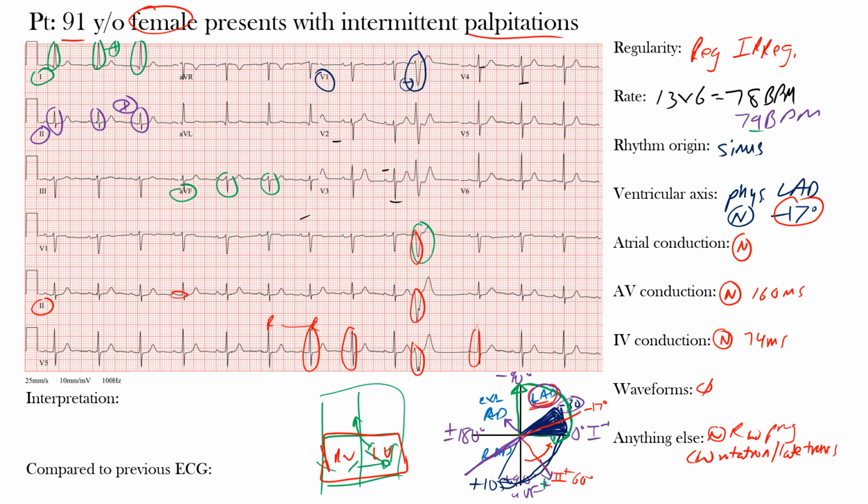Okay, and why is that? Well, imagine lead V1 sitting over that right ventricle. It's one of our right precordial leads. Okay, and if you have the ectopic focus originating from within the right ventricle, it's going to head away from it. So if you imagine V1 somewhere in this region and you have the complex originating from here, it's going to head away from it, so you'll see a negative complex.